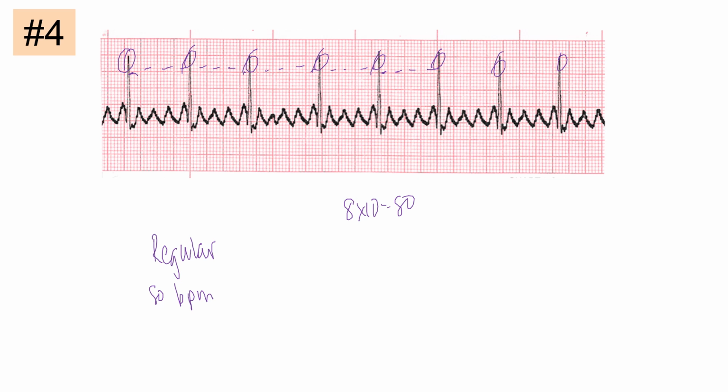What is the rhythm? So we know that the ventricles are contracting, okay, but there's also this. This is not a true P wave. We're only supposed to have one wave here, and it's usually round. These are not round, and they're not squiggly like the previous one. The squiggly one was like this. Remember, you can't really discern. These have kind of, you can kind of see each wave here, and these are called F waves. Okay, so this is atrial flutter.